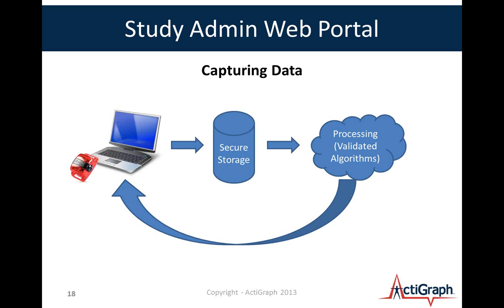I mean, you're not waiting hours for your data to process. That's a huge win for some of our customers who need to get feedback during a pre-screen. Perhaps if a patient didn't meet their required prescribed wear times, they need to know that immediately, and the system is able to provide that.